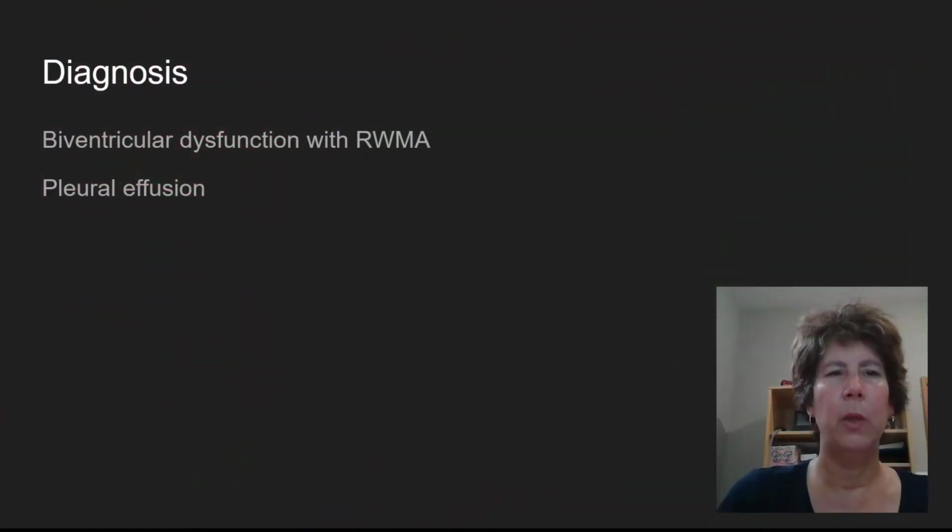Okay, so what was our diagnosis for this dare to diagnose? Correctly diagnosed by everybody: significant biventricular dysfunction with regional wall motion abnormality and a large pleural effusion. So good job, everybody.